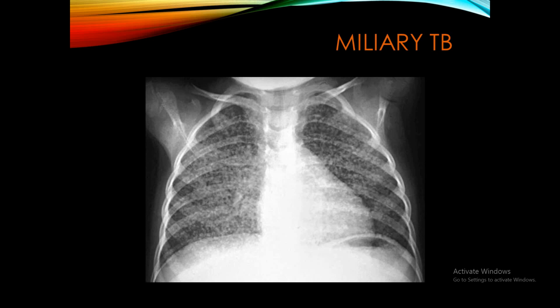طبعا هذا الملياري اللي موجود بهذا chest x-ray هو في طفل, and this is manifested by the non-fused epiphysis. إذا تلاحظون إنه الepiphysis of the humerus is not fused, this is skeletally immature skeleton. ولما نخلي differential diagnosis يعني طبعا of course الميتاستاسيس والpneumoconiosis are unlikely in pediatric age group. فإذا we are left with the infections especially the TB and the chickenpox. وبالمناسبة both the primary and the post-primary TB can present with the miliary shadow.